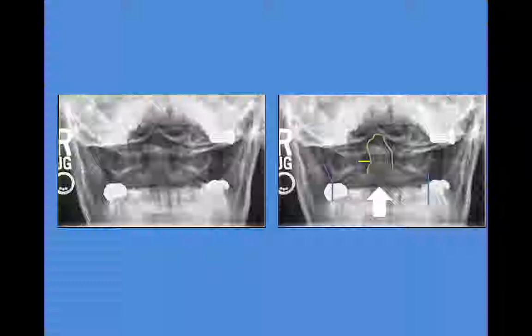Then you're going to run your eyes over the bones, the borders of the lateral masses, the cartilaginous spaces between C1 and C2, and then the cortex of the odontoid process. This white arrow is to remind you to look right here to see if there's any lucency extending down into the body of C2. On the AP view, we're going to look at alignment laterally.